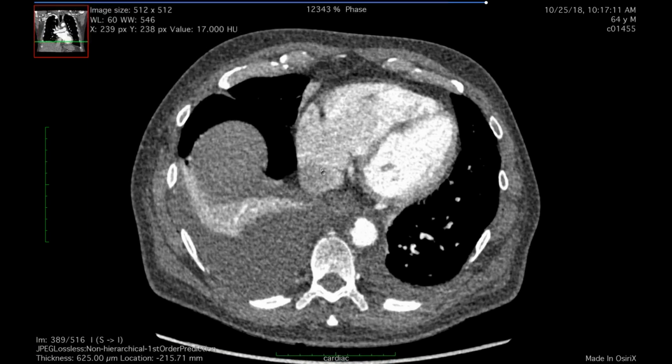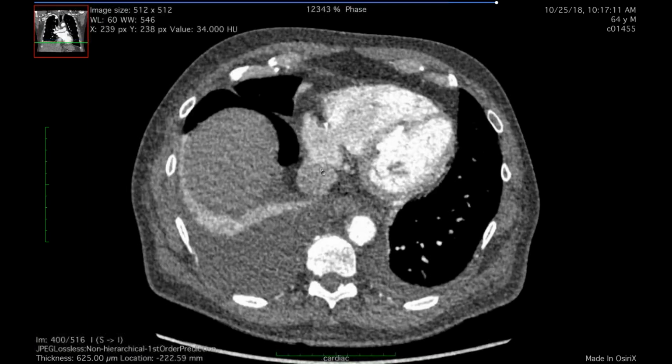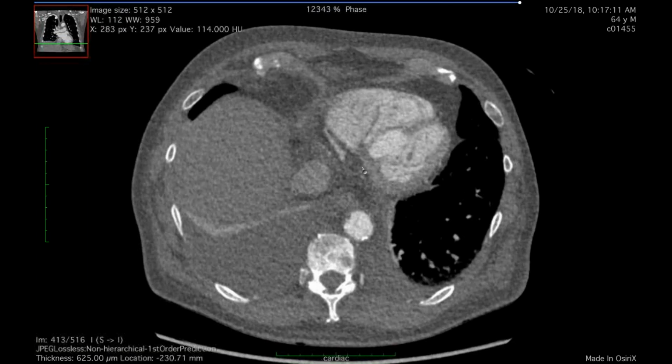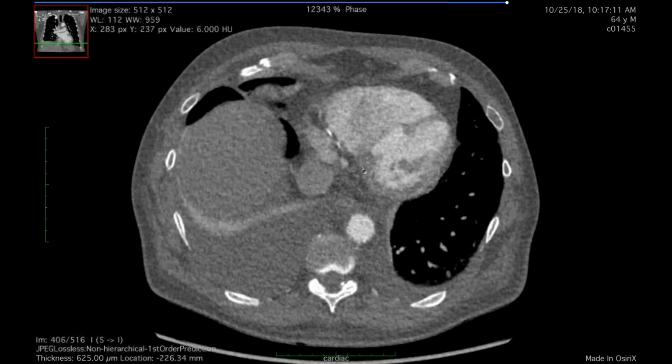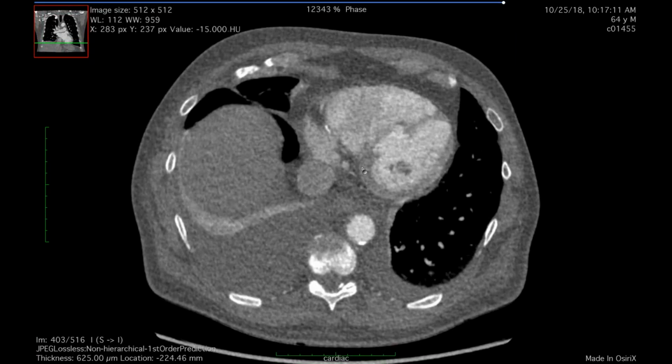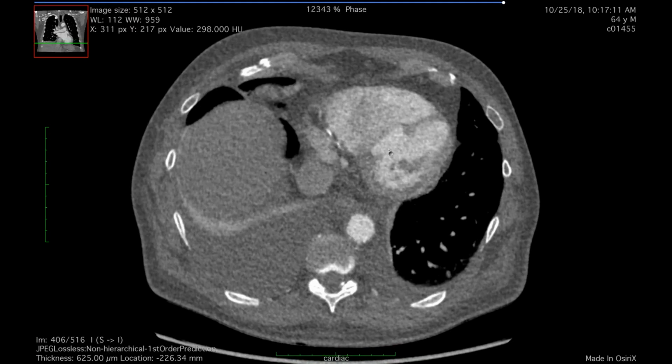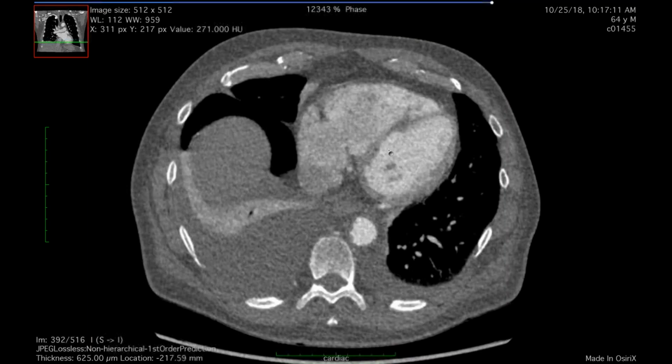We've had a couple of these cases recently, and it is a pain to measure that defect, because it changes between systole and diastole. There's a dramatic change, believe it or not. Not dramatic, but a few millimeters in each direction. But their Amplatzers or their plugs are variable sizes, and you're putting it into, that was going to be my next question, necrotic tissue. They got necrotic tissue. Absolutely.